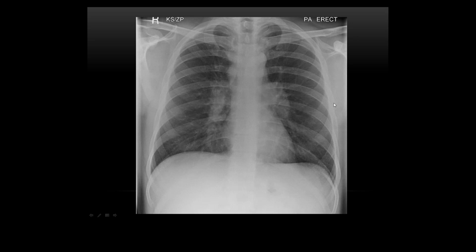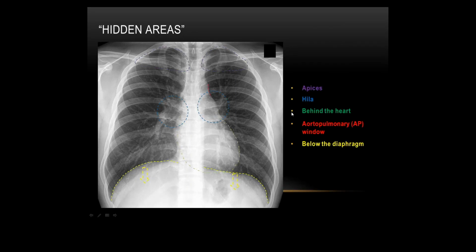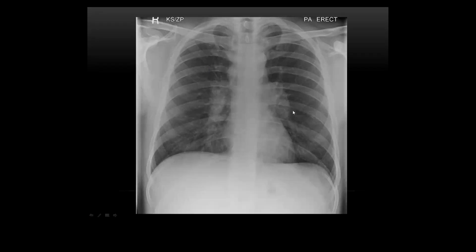Good, yeah, exactly. So look at your hilum. If you compare it to that chest X-ray, look at the density of your hilum. So that's your normal vascular density. And then come to this one and look how dense they are. They're a lot bigger. You can see the hilum angle there, but you can't see it as well on that side. It probably is there, but you've got a bit of soft tissue just next to it here. So yeah, they've got quite good hilar lymphadenopathy.